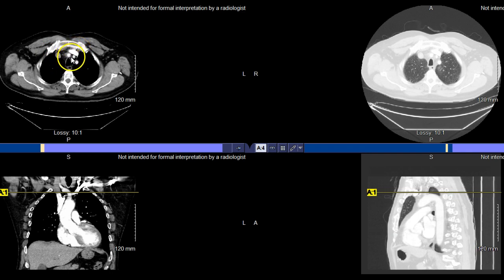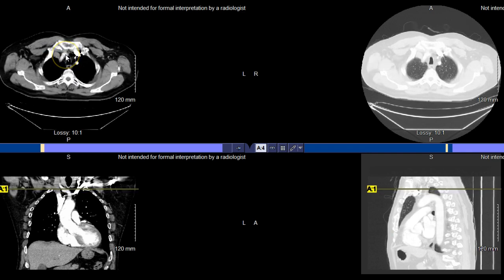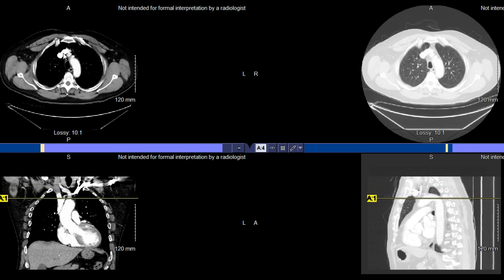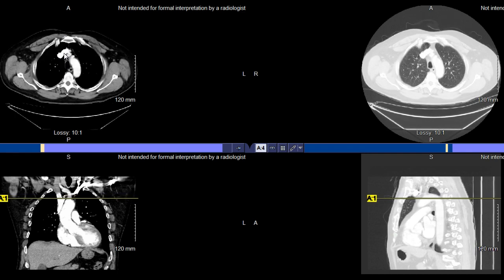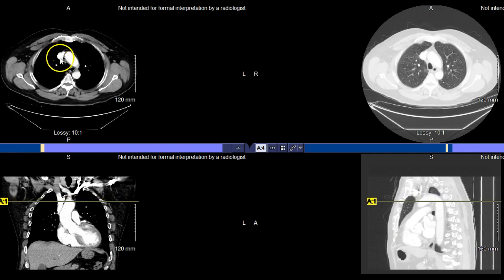Subsequently, then we can see our arteries. So here is basically those 3 main arteries that are coming off of the aortic arch. We're superior to the aortic arch, so we're actually seeing them as they are here. So this would be the brachiocephalic artery, left common carotid, and left subclavian artery here as well. So the 3 arteries. So I want you to see basically as we go down how these 2 veins then combined to form our superior vena cava. So you can see that combination point. Those brachiocephalic veins are coming down and forming that superior vena cava.